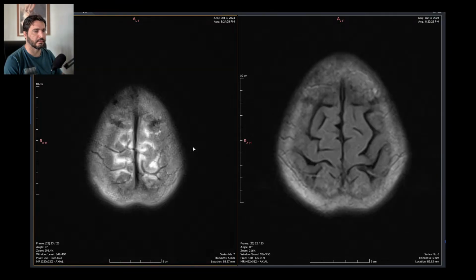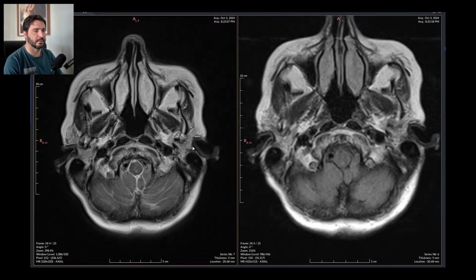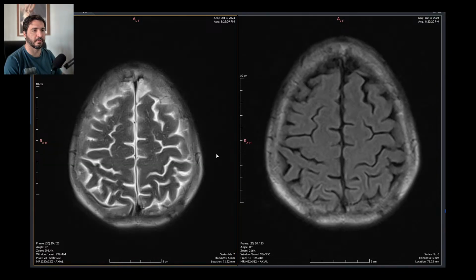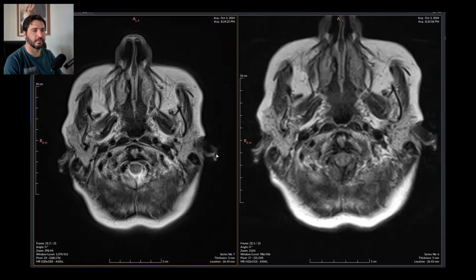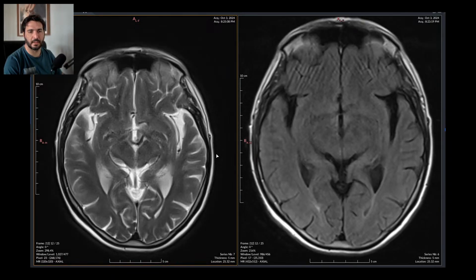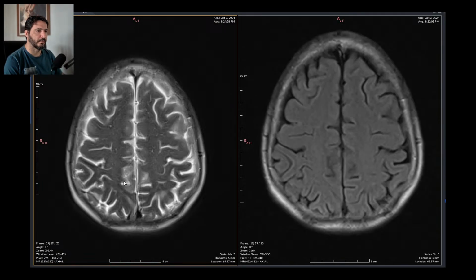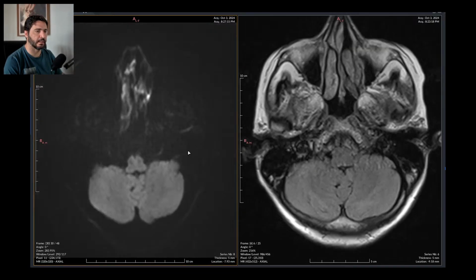T2 shows more anatomy. This exam is of poor quality, lots of noise, lots of artifacts of some kind, maybe just an old coil, improper calibration, but I can't really tell if there is anything wrong with these sequences other than poor quality of scanning.